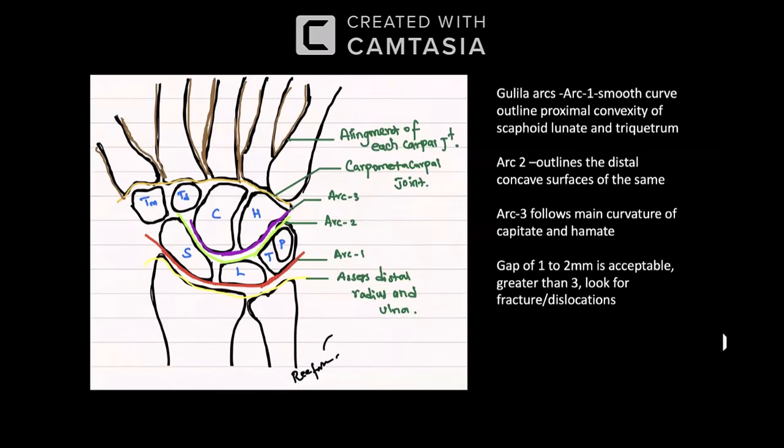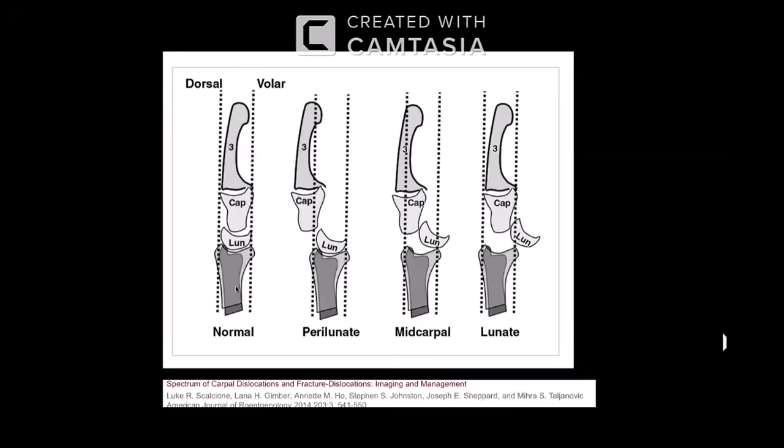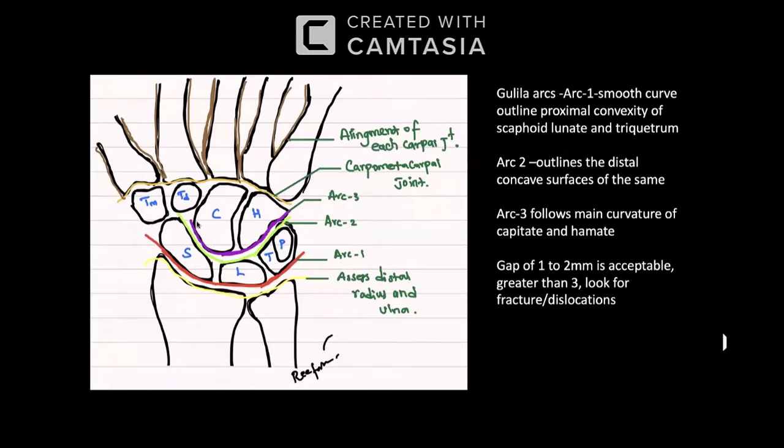The other yellow line indicates a sawtooth appearance, or zigzag pattern, that has to be maintained with the distal metacarpal bone. So there should not be any discontinuity in any of these lines. Again, the brown line also, you need to look at the alignment pattern, so that there should not be any associated fractures in the metacarpals.